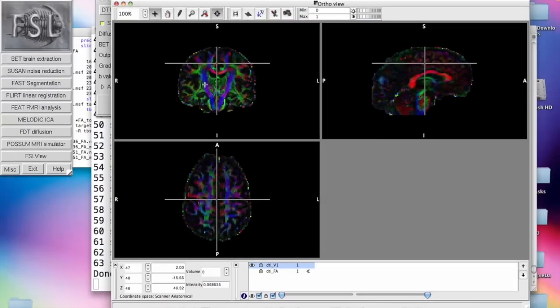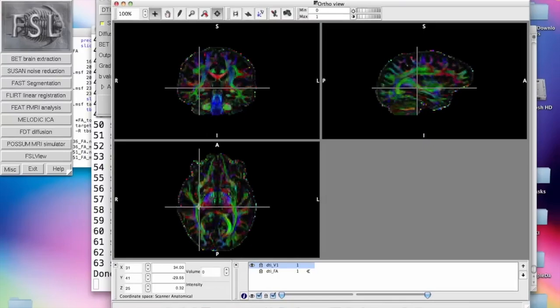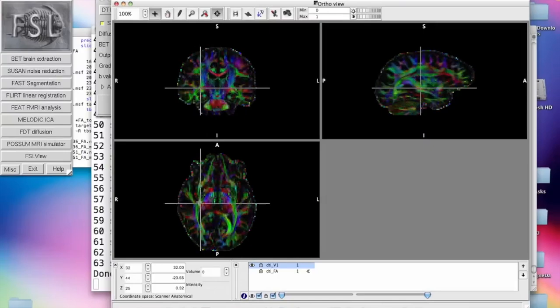So what's going to be brightest showing up in this map is where the diffusion is the greatest in a particular direction. Okay, so that is just the fractional anisotropy step where we actually create the tensors, and then the rest of it is just going to be some more processing and then the actual statistical analysis to compare tracts between, let's say, two groups.